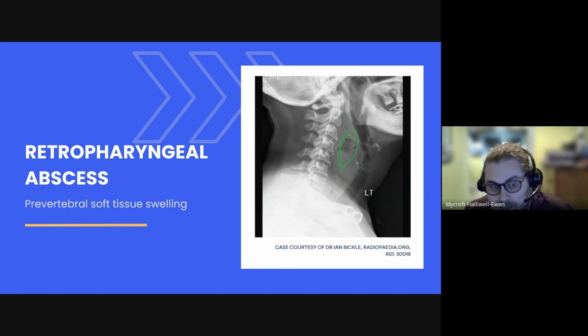So this is a massive retropharyngeal abscess, and this is generally life-threatening from both sepsis and from an airway point of view. Very, very difficult to manage. Needs very urgent operative intervention to secure the airway and to drain. Probably would aim for an emergent tracheostomy and then drainage of the abscess. Secure the airway first. Good.